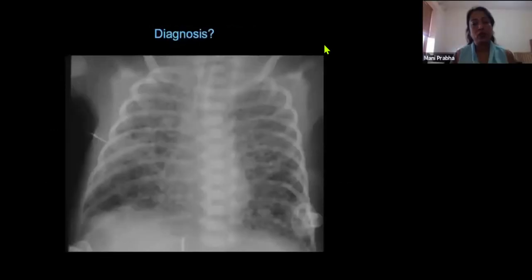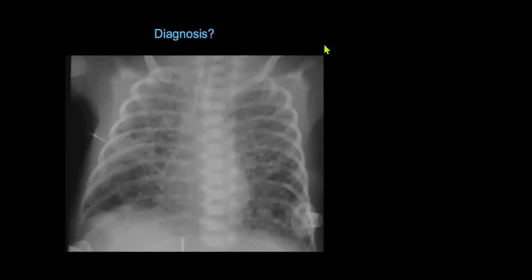Okay, next case for you, candidate 1. So this is a frontal radiograph of a child. There's an ET tube which appears to be in satisfactory position, and there's also a tip of a tube arising from the abdomen in the right upper quadrant.